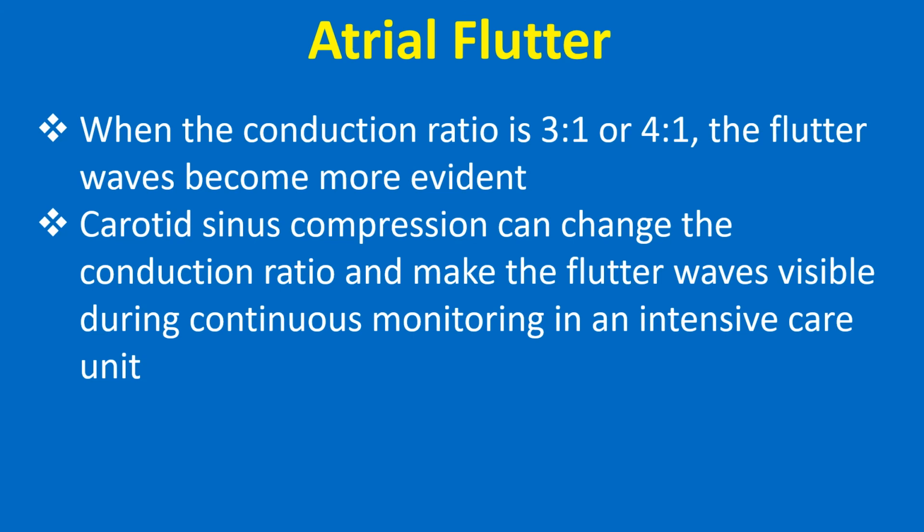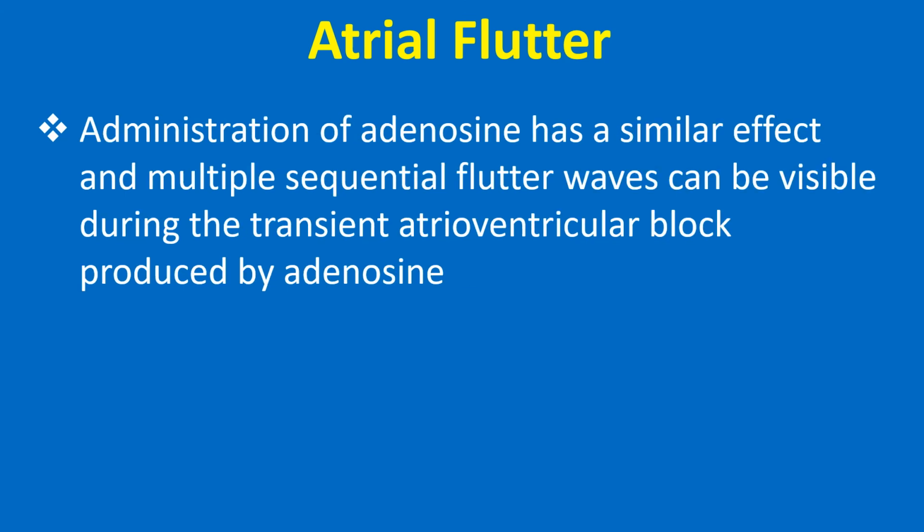Carotid sinus compression can change the conduction ratio and make the flutter waves visible during continuous monitoring in an intensive care unit. Administration of adenosine has a similar effect, and multiple sequential flutter waves will be visible during the transient atrioventricular block produced by adenosine.